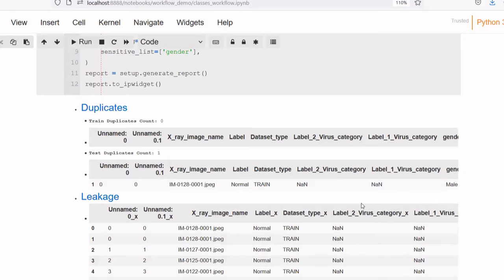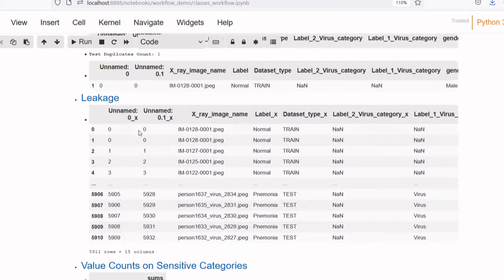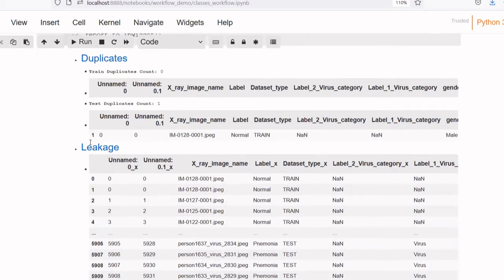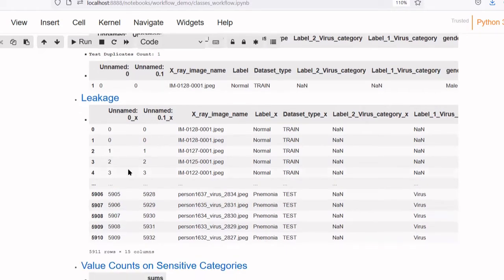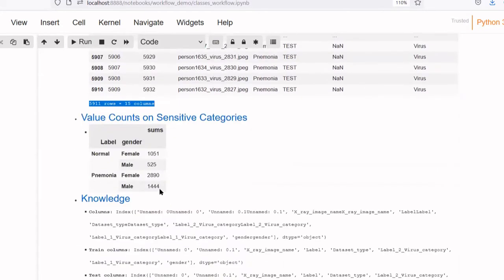This is a data set that I have made explicitly, specifically to showcase the possibilities for using cleanX. I used almost identical data sets for training and testing to show that it would catch ones that were repeated, which I have called leakage. If you have images in your train and test data set which are the same, you have what I call label leakage, and you'll want to catch this. In this case, I've used two data sets that were almost identical, so almost every line is the same, and they will show up as leakage.